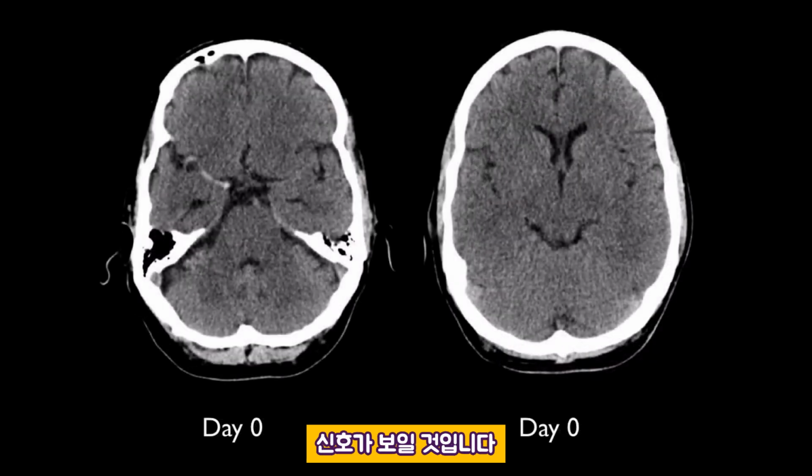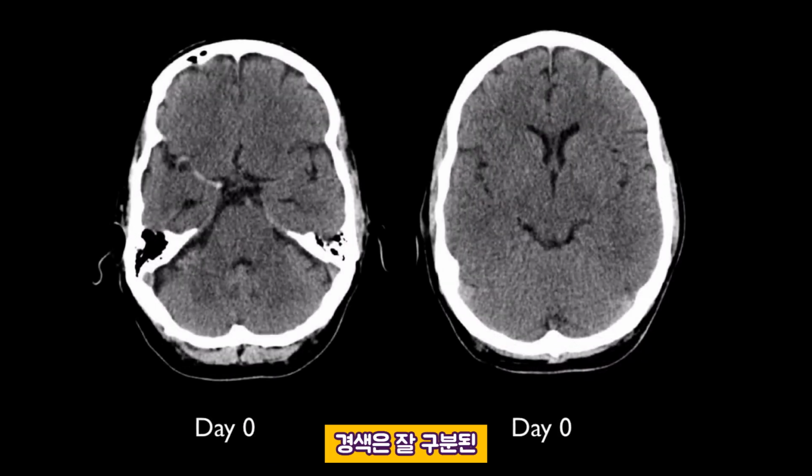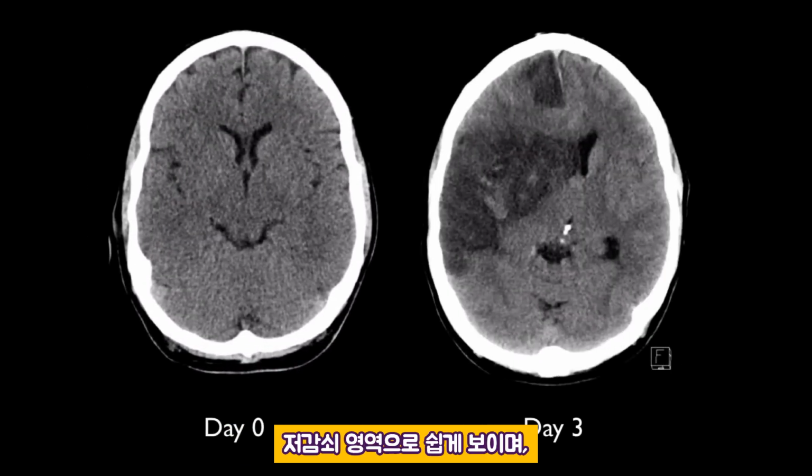Going back to our previous patient, over the next couple of days the infarct becomes easily visible as a region of well-demarcated low attenuation, in this case with some areas of small hemorrhagic transformation. This is associated with swelling as extracellular and intracellular fluid accumulates. This is due to cellular swelling and breakdown of the blood-brain barrier. There is corresponding positive mass effect.